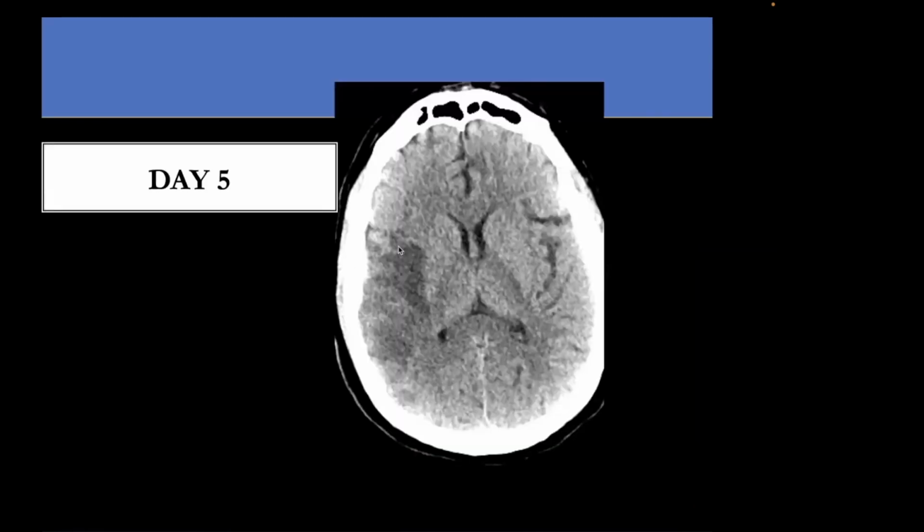Here we are at day 5. The infarct is better defined, more of a wedge-shaped cortex and white matter involvement that touches on, as you can see, the lateral border of the basal ganglia here in this MCA territory infarction. So the infarct is progressing as you would expect. This one has not a lot of mass effect, although you can see the Sylvian fissure looks different on the right side and the left side. There is some swelling. At this point, we're dealing mostly with cytotoxic edema.